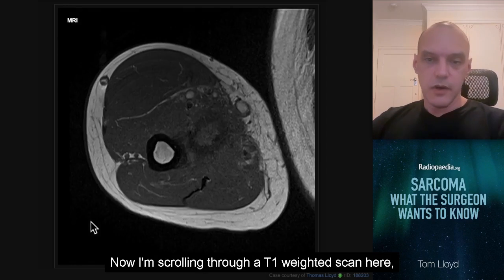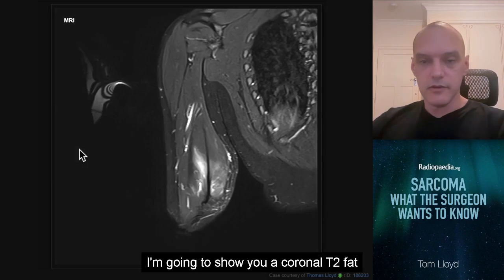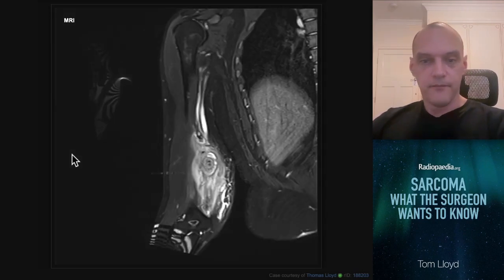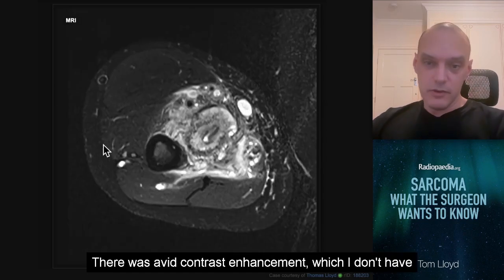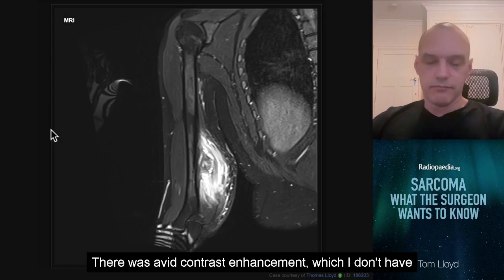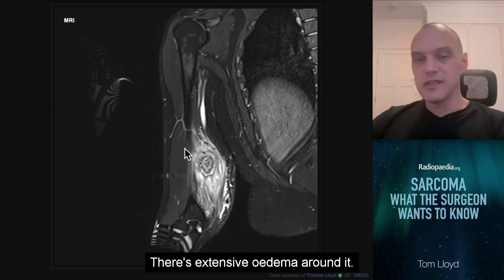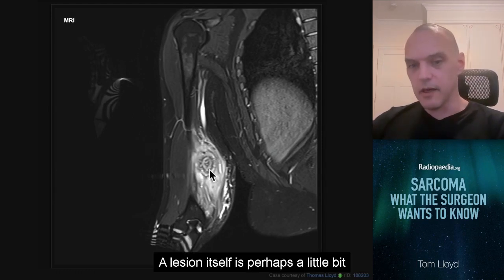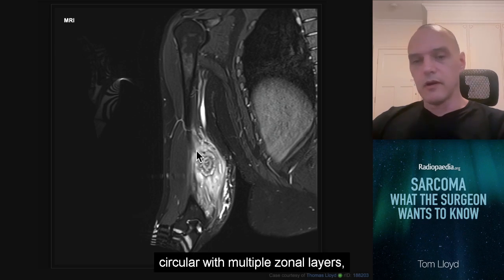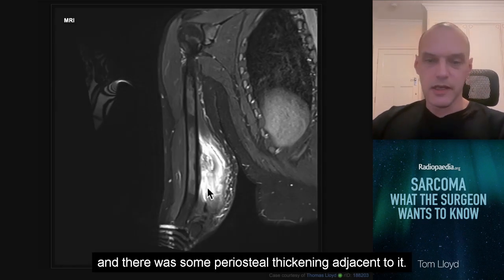Now I'm scrolling through a T1 weighted scan here. I'm going to show you a coronal T2 fat saturated sequence and an axial T2 fat sat. There was avid contrast enhancement, which I don't have to show you, but there was avid enhancement. What we can see is there's a lesion in the soft tissues. There's extensive edema around it. The lesion itself is perhaps a little bit circular with multiple zonal layers, you might say. And there was some periosteal thickening adjacent to it.